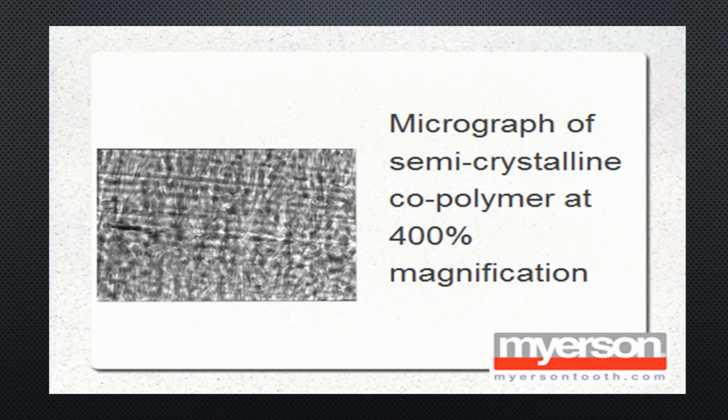Whenever we injected most of this material, grinding on it was so much nicer than a lot of materials out there. That's why also it's able to be milled.